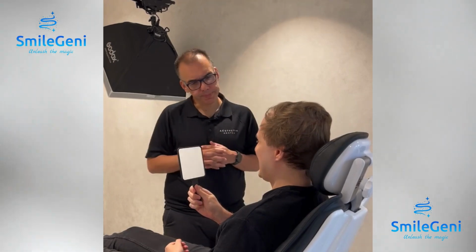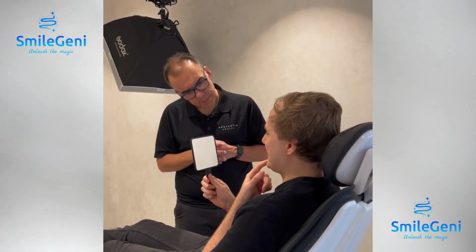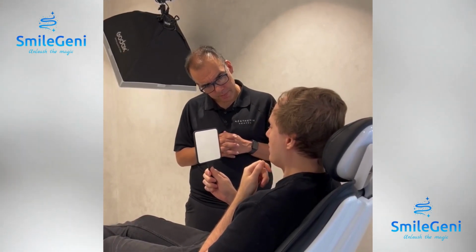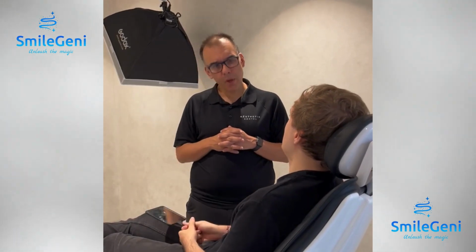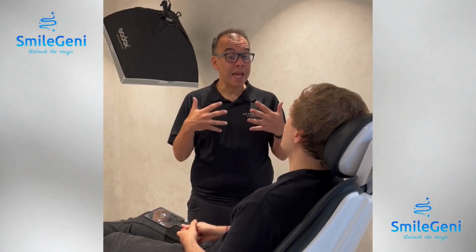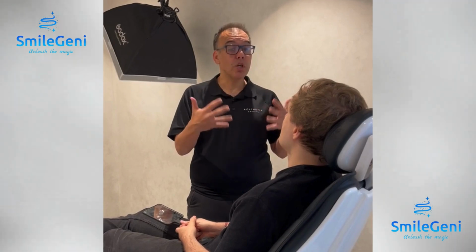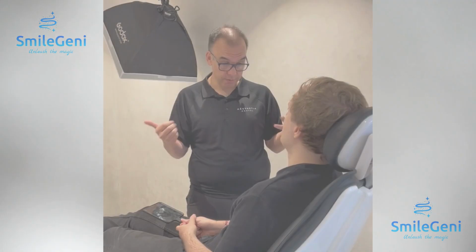What could change you? Well, I always was conscious about my crooked teeth, and I also don't like the color. And hopefully, I was also thinking of improving the shape. Okay, so what we're going to do is use Smile Geni, an AI smile transformation tool that will help us show you what's possible. Okay? Within seconds. How does that sound? Yeah, sounds good. Great.